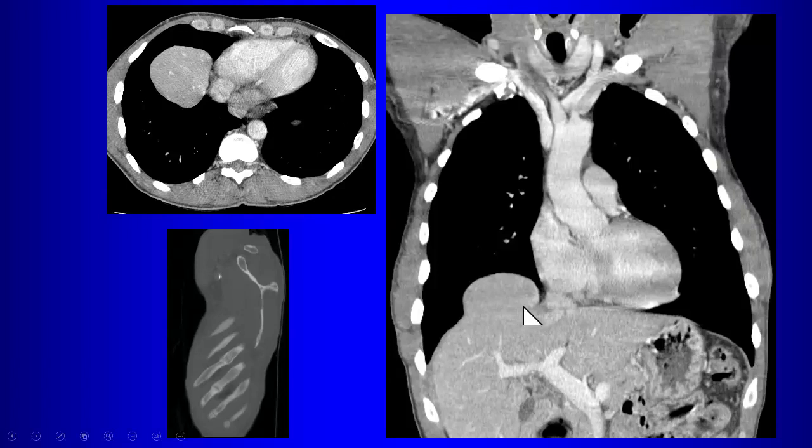So what's the story? How could this occur? Well, what do you see? So these are old rib fractures, right? So this is a patient who has a remote history of trauma, had a diaphragmatic hernia here, and it comes back after the rib fractures have healed, and we can see that there's liver now herniating through this rupture in the diaphragm. That was a complication of this patient's trauma. Okay.